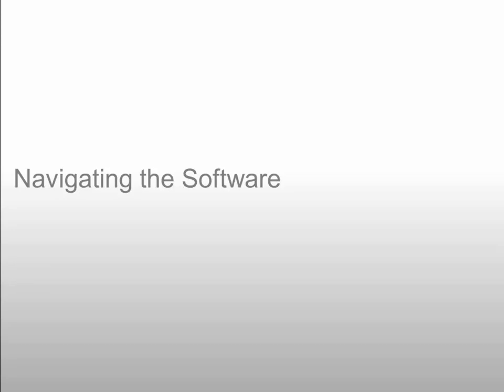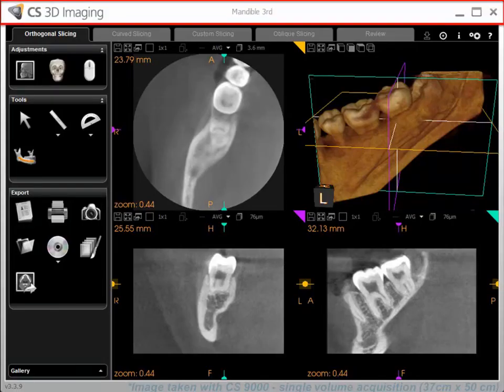Navigating the software. After launching the patient's volume from your imaging management program, you will notice the title bar along the top of the software where you will find the product name on the left side, the name of the current patient in the center, and the standard Windows controls on the right side.